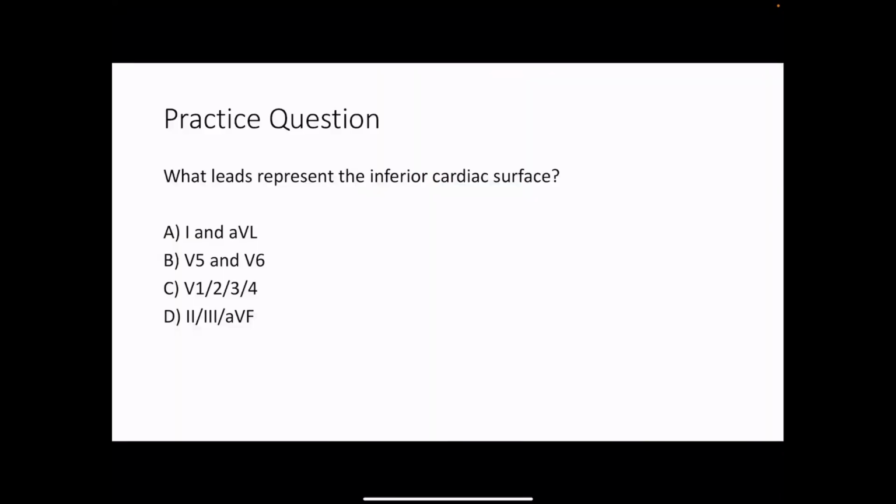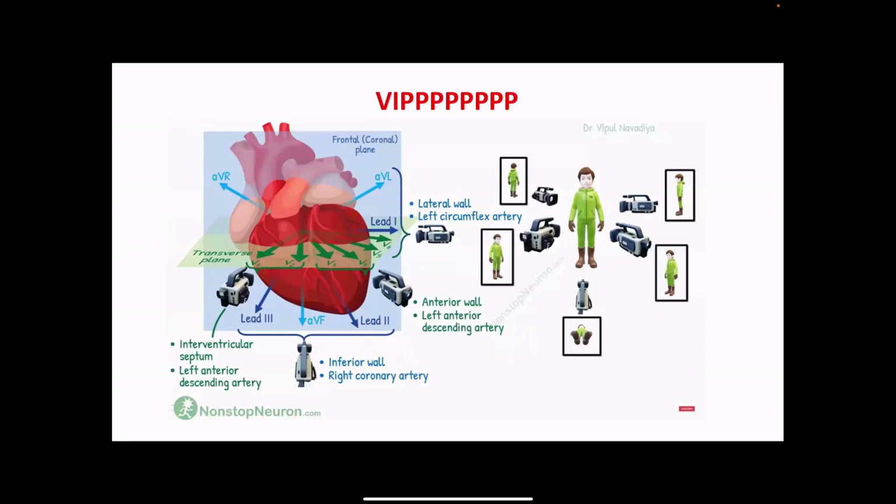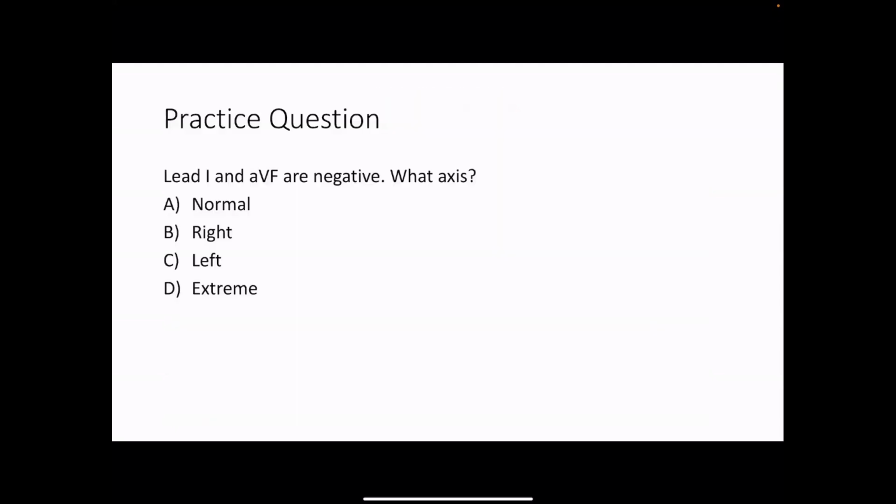Now, what about this one? D. D? Yes, it's D. Do you guys remember this one? Please remember this one. Okay. What about this one? Extreme. Okay, why?